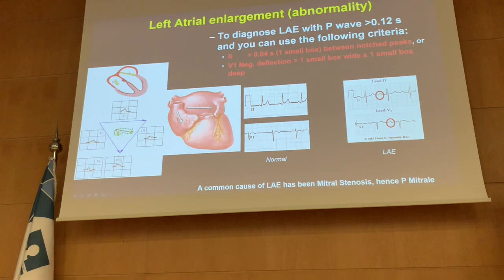Because the heart rate goes up and mitral stenosis increases in severity. So we took this patient and did an ECG for her, and we are really interested in the P wave because she has mitral stenosis. In the scenario, they will tell you the patient has a diastolic murmur that increases with exercise. This is typical for mitral stenosis.